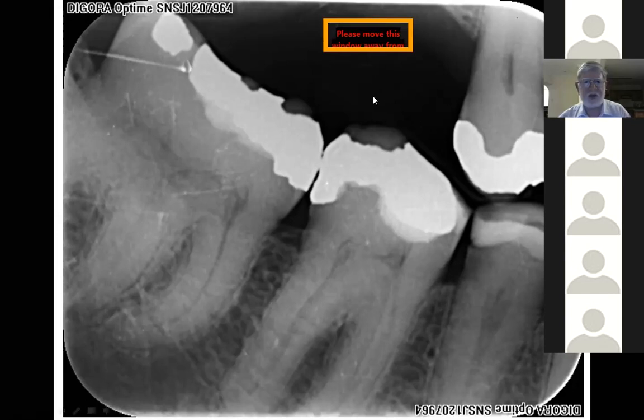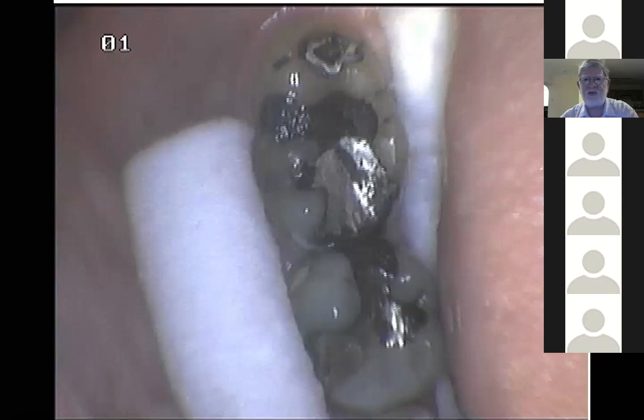And imagine if you had to root treat that. That would look really sexy by the time you finished root treating that. So here we are. There's the tooth clinical view. And you can see if you're comparing the fused 7 and 8 compared to the 4, 6, that 7 was probably heading to about there, perhaps. And then you've got this 8 fused to it. Interesting.